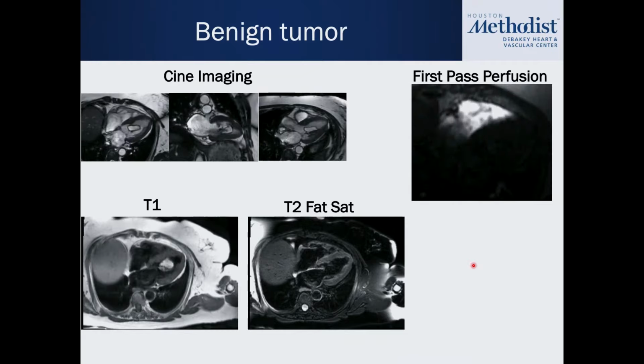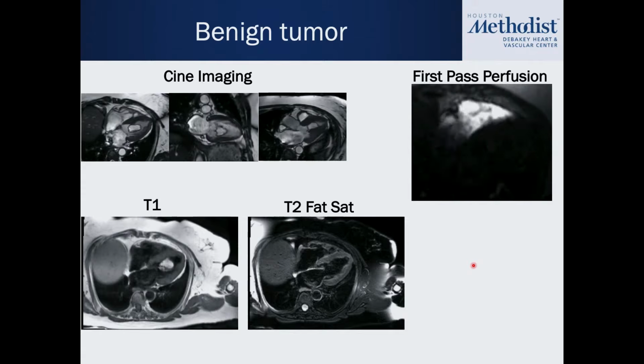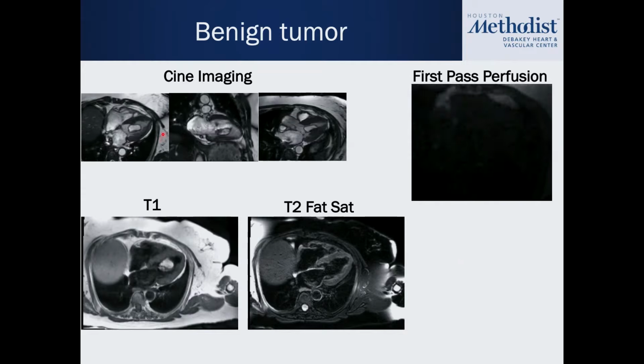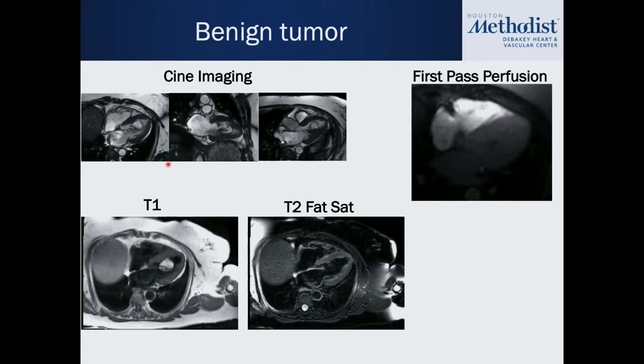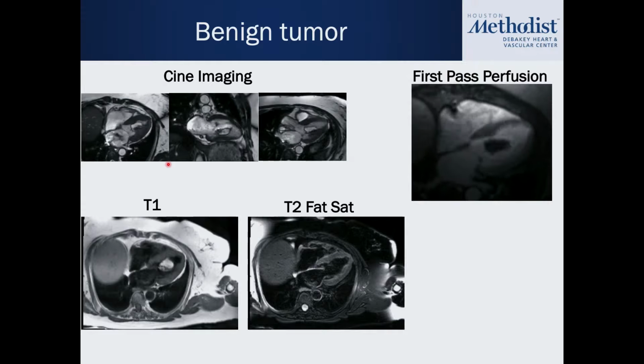I showed it to some of you in the lab. Let's see if someone will be able to figure this one out based on what we talked about so far. Not the MRI fellows. So as you can see, on the cine imaging, as we said initially, we have the anatomic imaging. So we have a mass situated inside the ventricle, right?